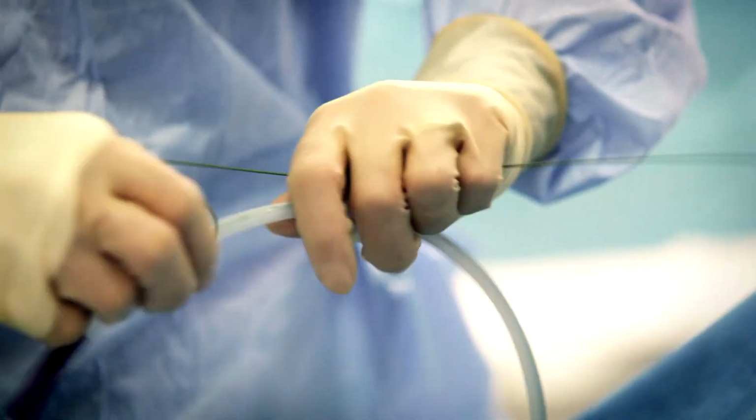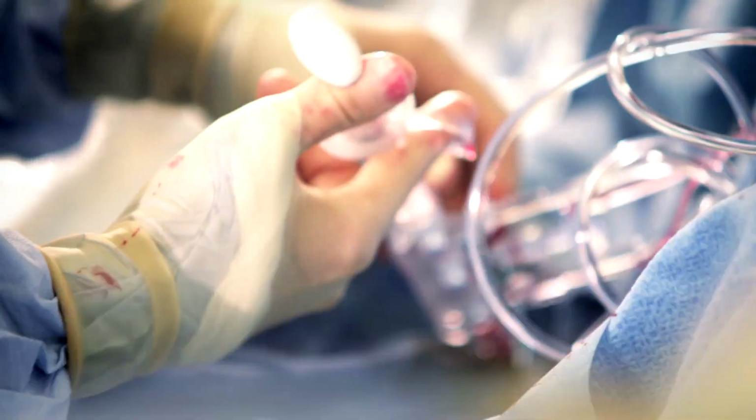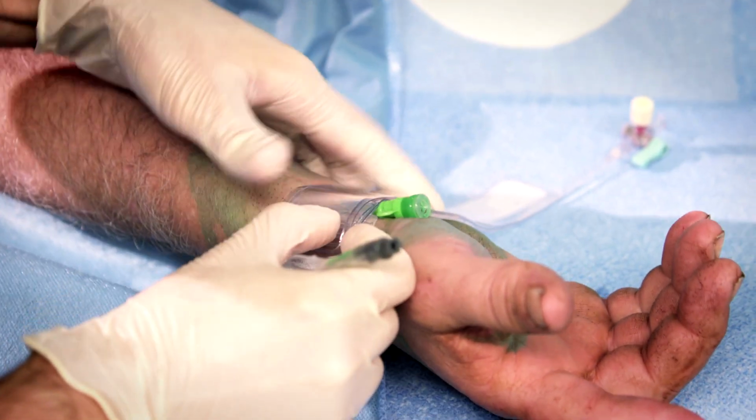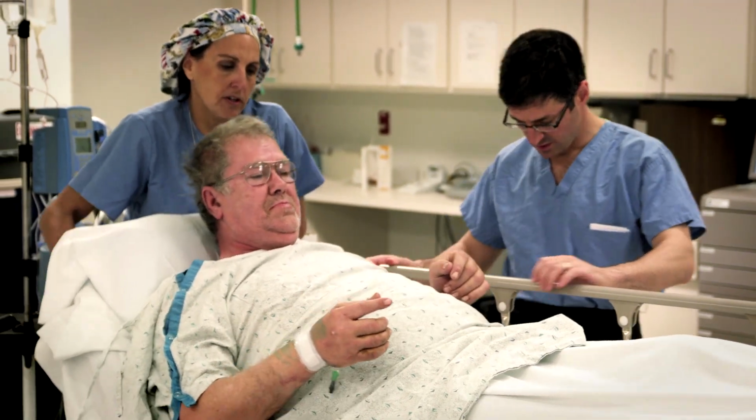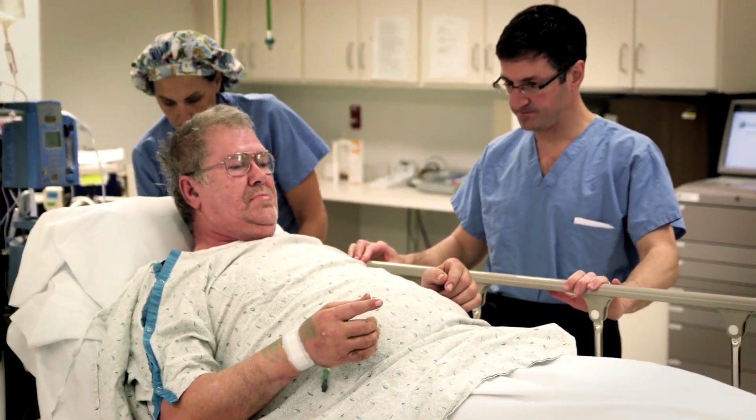There are really two major areas where this procedure may provide an advantage for the patient, and the first is comfort. Immediately when we're done, we take the tube out. We usually put a bandage or a little splint-type device on to control the bleeding, and the patient can sit up immediately after the procedure. Traditionally, after a procedure from the leg, you have to lie flat for several hours.